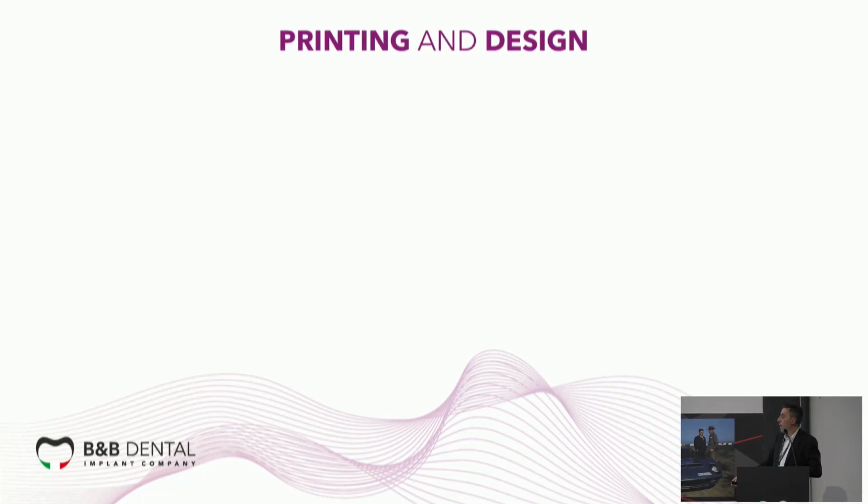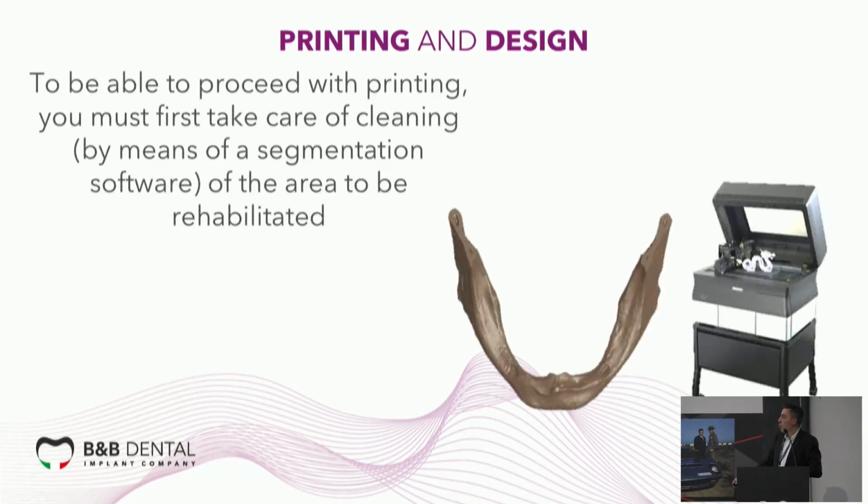Printing and design. To be able to proceed with printing, you must first take care of cleaning. Because when you send me DICOM files, the DICOM file is not clear, it is like a fog, not very clean. So we have to use a segmentation software that is present as a tool in our software for guided surgery, and you can use it to segment the bone, mandible or maxilla. And then we can print the part to rehabilitate.